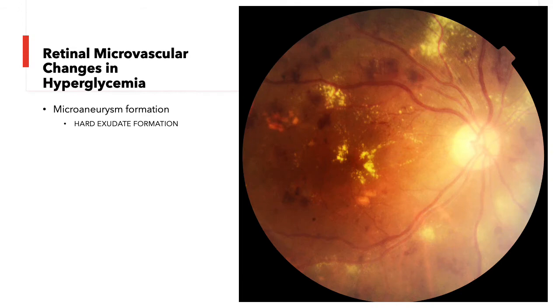These microaneurysms have very unstable walls, and they tend to allow intravascular contents to spill out from the walls. Blood should remain inside the blood vessels under normal conditions. However, the microaneurysms reverse these features.